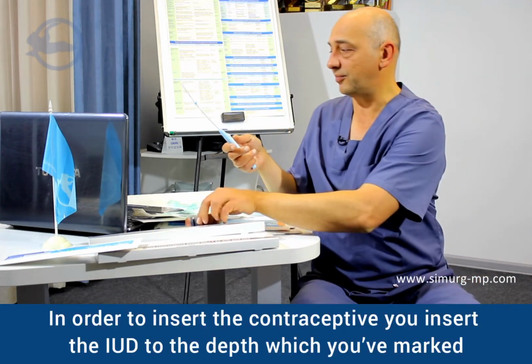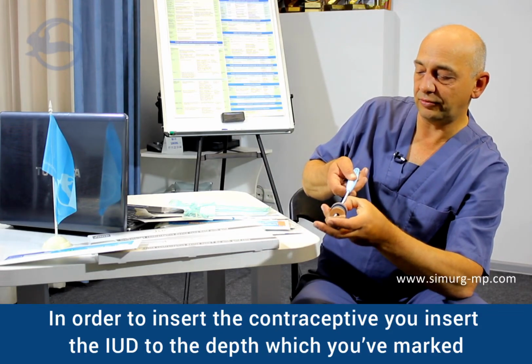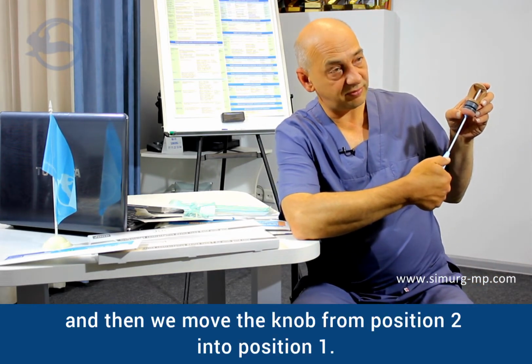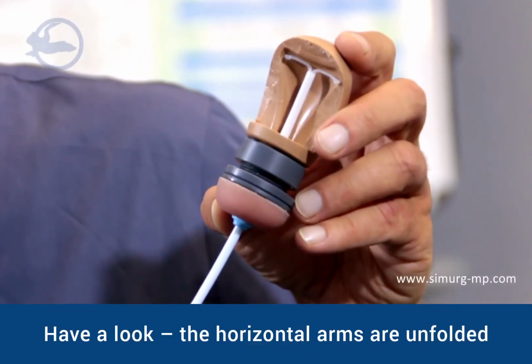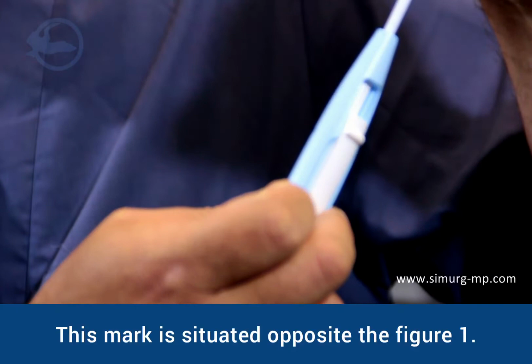In order to insert the contraceptive, you insert the IUD to the depth which you've marked. And then we move the knob from position 2 into position 1. Have a look, the horizontal arms are unfolded. This mark is situated opposite the figure 1.